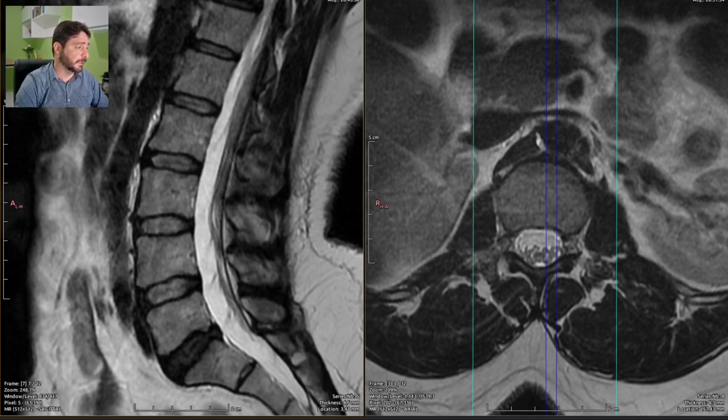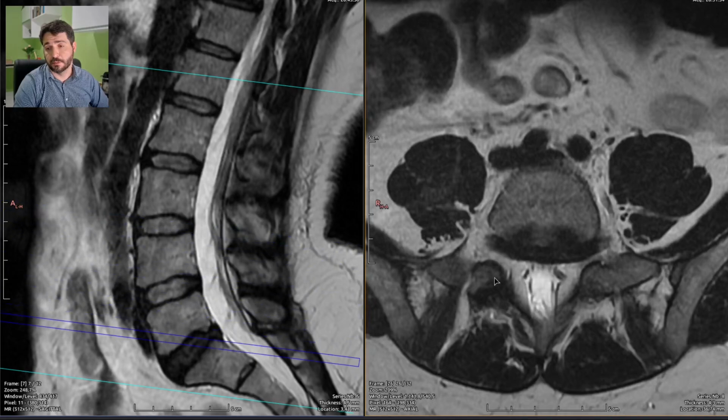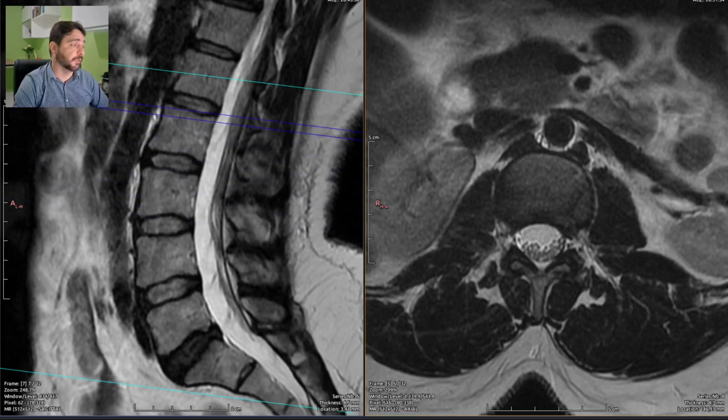So this is it. Is the hypertrophy of muscles. Very, very mild. I'm going to let it pass. So let me grab a proper template, because templates help a lot. And small osteophytes.